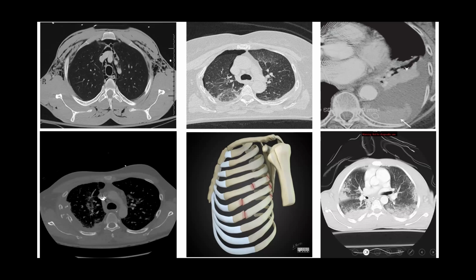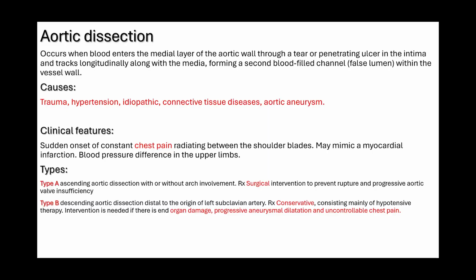Lastly, this is a lung window of the CT chest, shows peripheral ground glass, also consolidation. In cases of trauma, it could represent laceration, could represent contusion, could be related to aspiration, could be related to pulmonary hemorrhage. You should know the clinical scenario of the patient or history, the patient having hemoptysis or not, to suggest pulmonary hemorrhage. So after that, we move to aortic dissection.